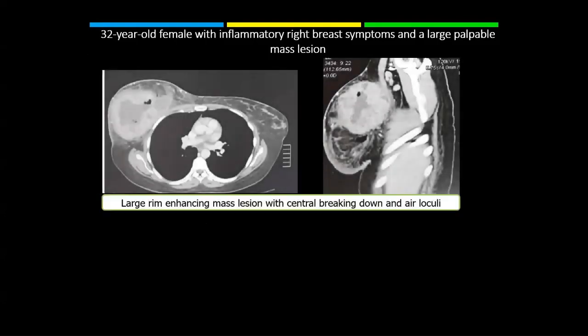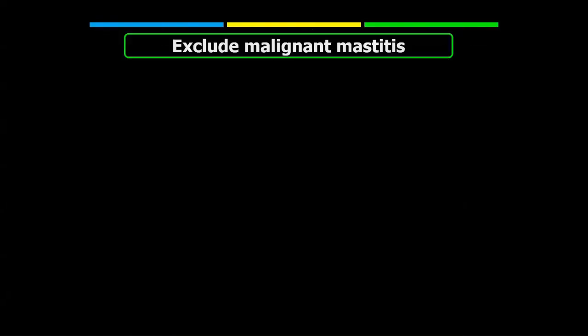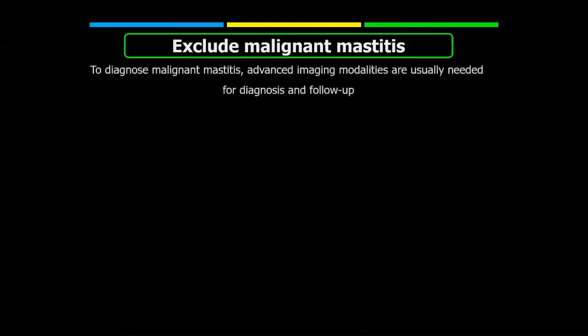This was her CT examination, and unfortunately, this patient was metastatic from the start, and this was a malignant breast abscess.